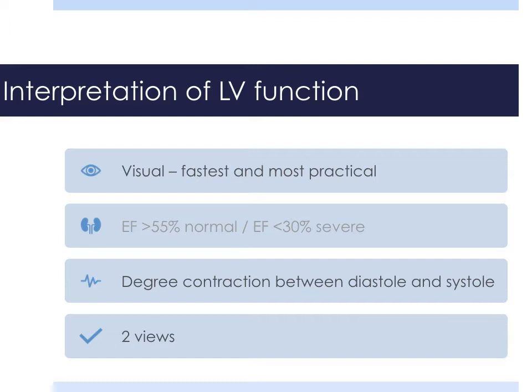We need to assess the left ventricle in at least two views, and carefully between systole and diastole, to get a more precise idea of its dimension and function.